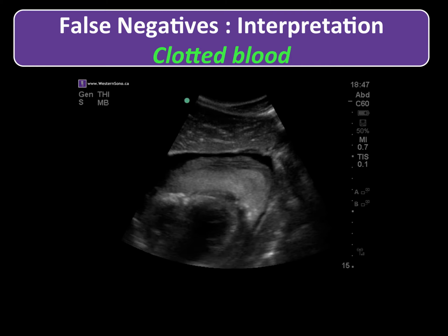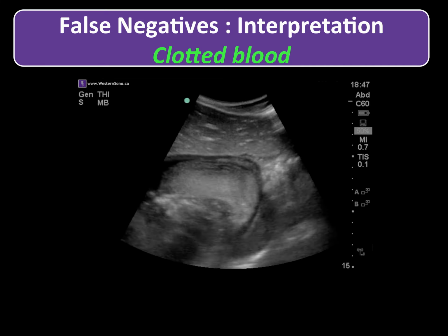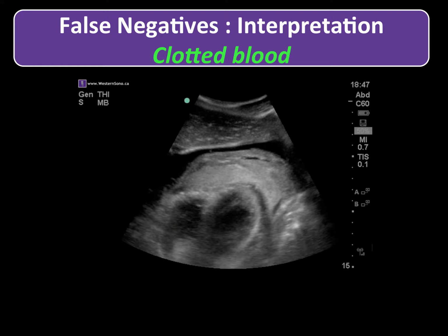This image is obviously of a heart, but illustrates the same principle. This patient sustained penetrating trauma to the chest. This was an acute presentation, but some of the blood had already pooled and clotted, and instead of appearing anechoic, appears almost hyperechoic. To review, the heart is seen here, the newer free-flowing blood is seen here, and this large hyperechoic area is all representative of clot. Let's have a look at the video again.